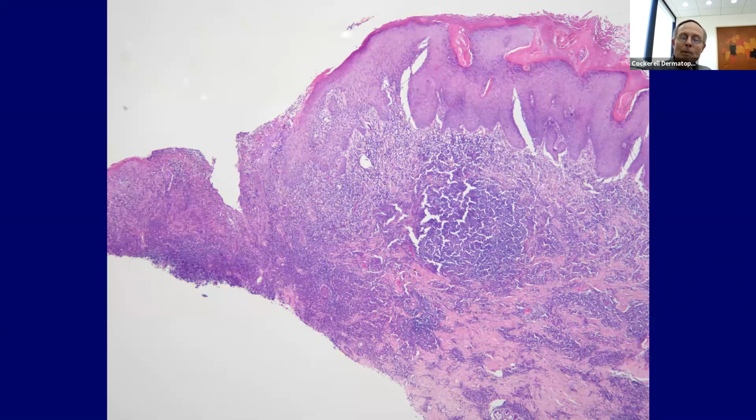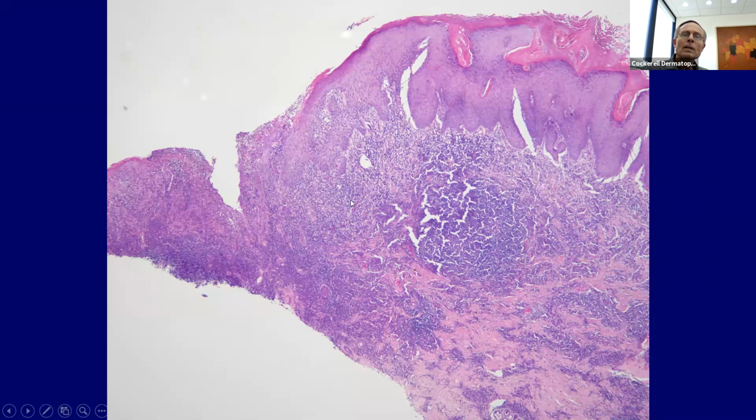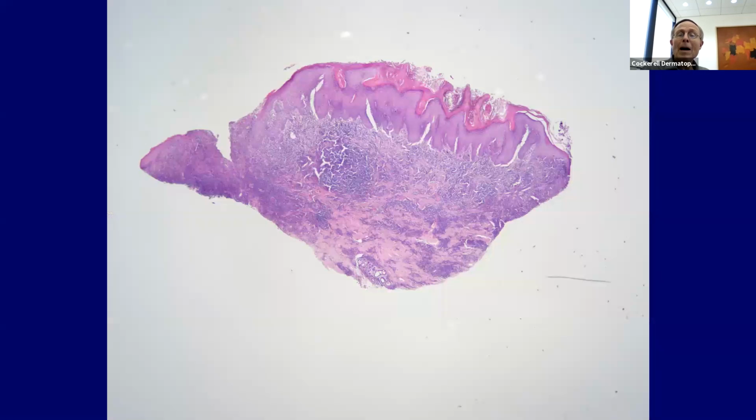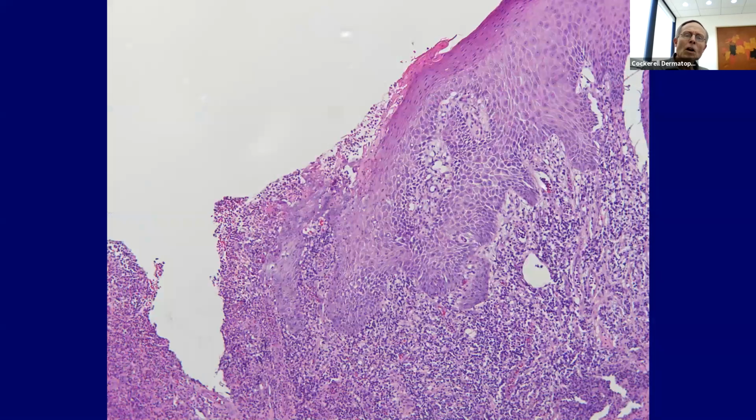than the typical finding. So if you're just looking at this, the diagnosis is probably like an irritated SK or a wart with a lot of inflammation in it. But why all the inflammation? There's something else going on there. And maybe there's two diseases going on. It's hard to tell what part of the body we're on. We don't have a lot of follicles here. So maybe we're near mucous membrane. And maybe the guy does have a wart. Then he's got this inflammation, and there's this ulcer over here, and it's got a very, very dense inflammatory infiltrate.